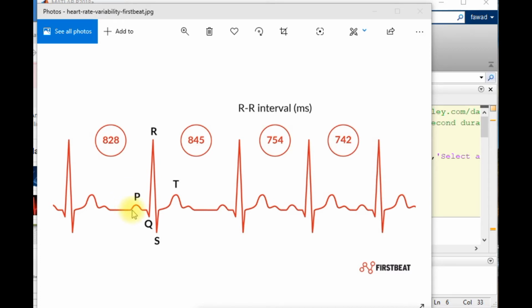If you look into the ECG signal, you will find that within one complete cycle there are a few sets of waveforms. The first waveform that comes is denoted by P. Then there comes a Q waveform, and then a sharp peak that is known as the R waveform. After that there is a negative S waveform, and then the final and last T waveform.